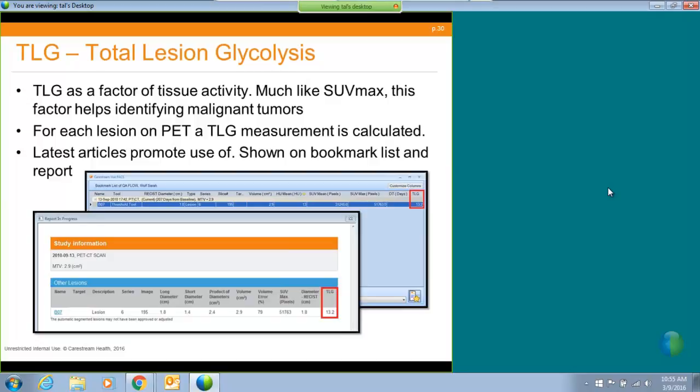Right click on the SUV annotation and change to SUV lean body mass, and see if it changes there, because most of the times when it can't show the TLG value, it means that it can't change to lean body mass because some of the properties in the study are missing: the patient height, the patient weight, or even the injected dose.